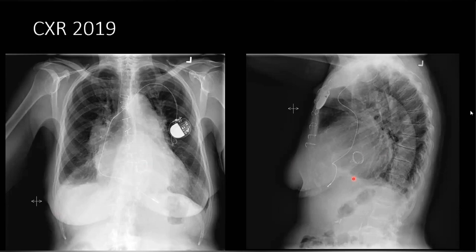So it's a mitral valve prosthesis, its direction is downwards from the atria into the ventricle. What is this one? So this is a cardiac device lead. No, the lead is over here. What is this ring-shaped opacity over here? So which one? Can you see my pointer? Yes, sir. So I'm pointing it out for you.